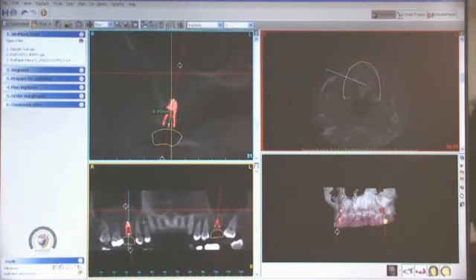Okay, and again, this is a good view to show how there's your mucocele or potential mucocele, and then you can see over here the thickening of the membrane on the patient's left side. Okay, we'll go from there. Let's start with number 3, and Tim, let you take it from there as far as what you want to do with this. Right now, we had left it just short of the sinus, or a little bit into the sinus, and you can give us your 2 cents on how you would treat this case.